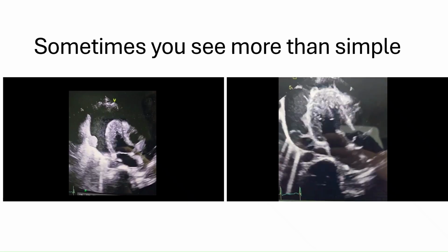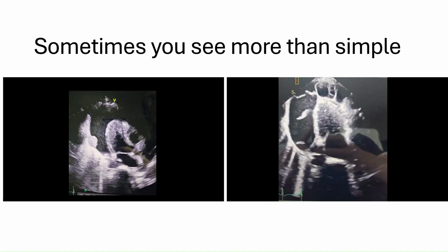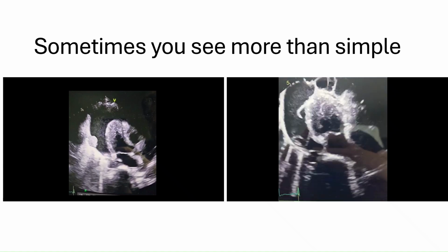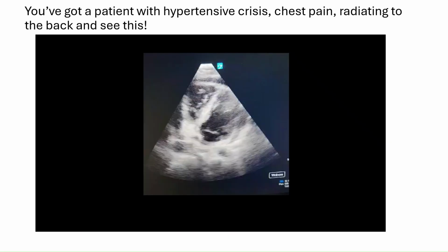And another case here, it's not a simple effusion, right? You see a lot of septations, you see a lot of fibrinous material there, so it will guide your management as well, right? Maybe just a simple pericardiocentesis is not enough, and maybe you're going to leave the drain there, or maybe you need to take out the pericardium, right, and do the pericardiectomy, right? So all this information is very easy to obtain with the ultrasound, and I think it will change the management plan as well.